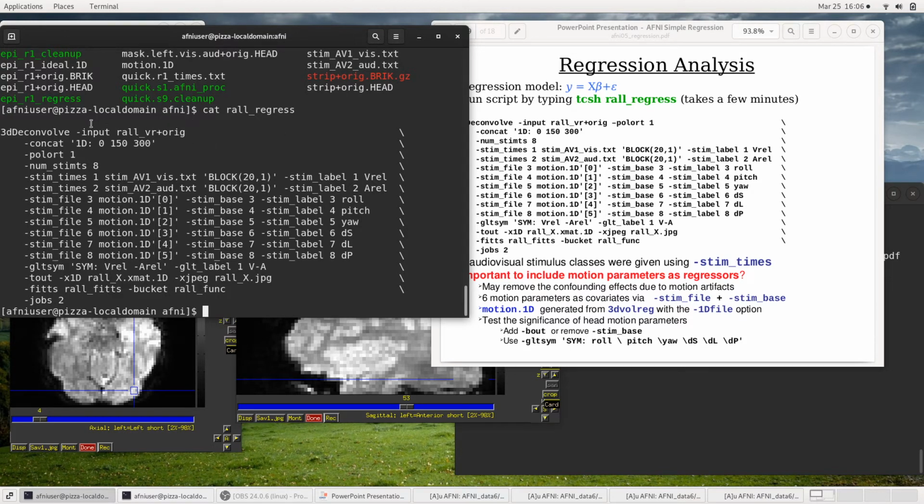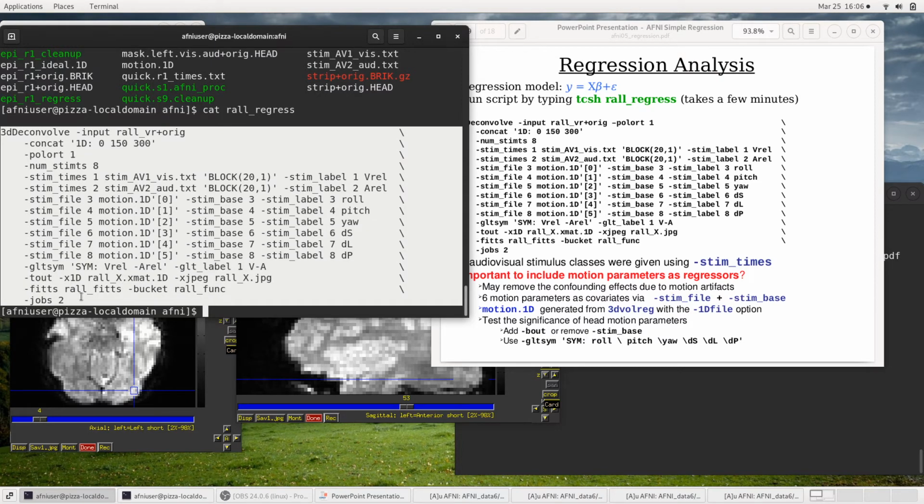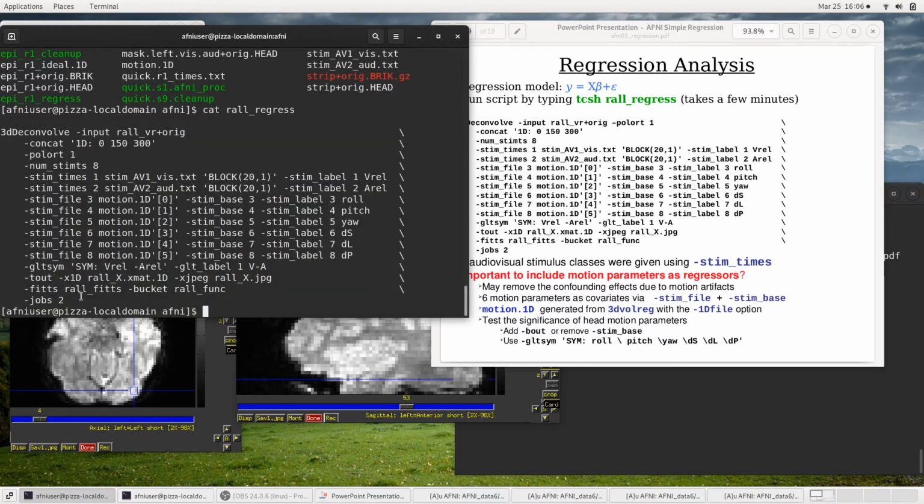if this is new to you, there are a couple of small details to note about this. One, this is one command, which you could type on the command line, but after making 73 typos and getting all frustrated and quitting before you get it done correctly, it's generally preferable to put your commands into text files, which we call scripts, and then make them look readable.